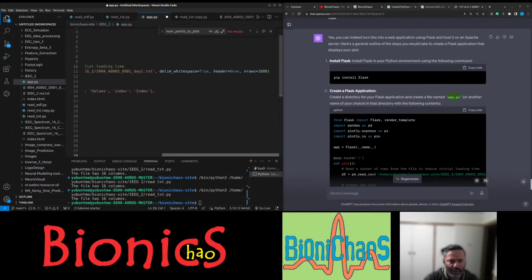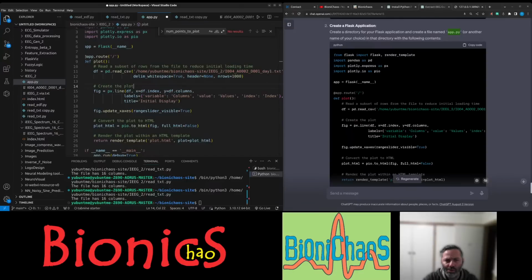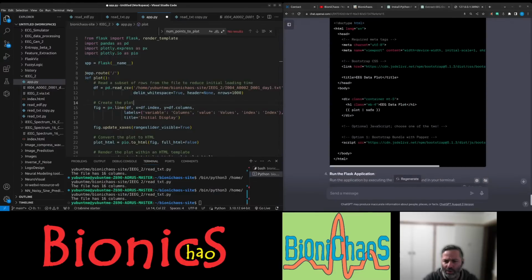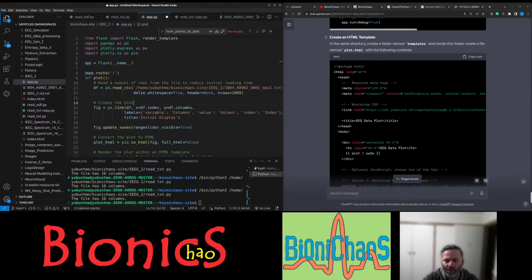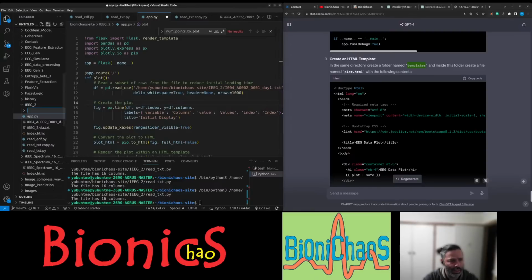This bit. Just do this just so we can see better. Some 100 stuff. Need a folder called templates. We have done this before, haven't we? Be professional at this. Not really. What's this called? Plot HTML, whatever, doesn't matter.